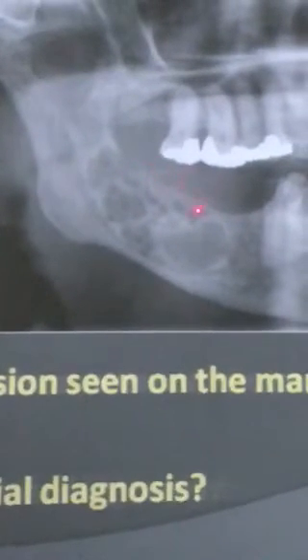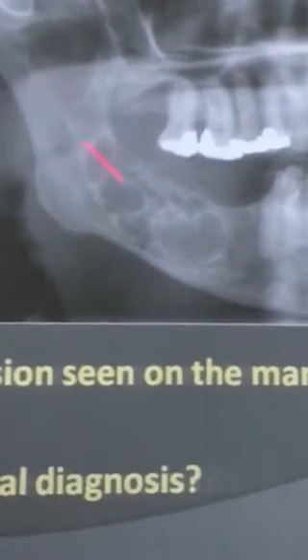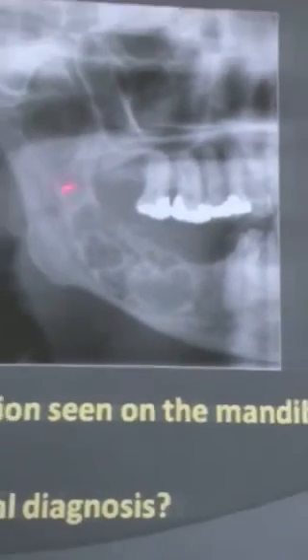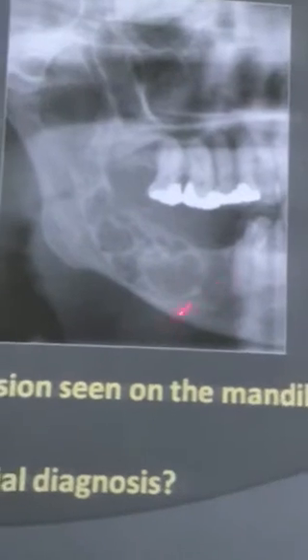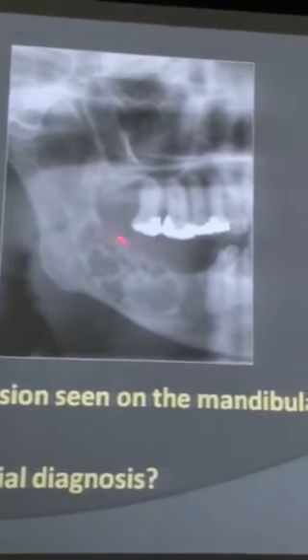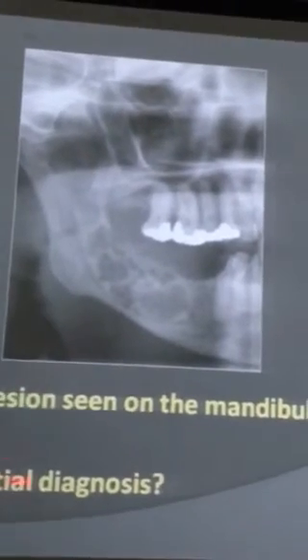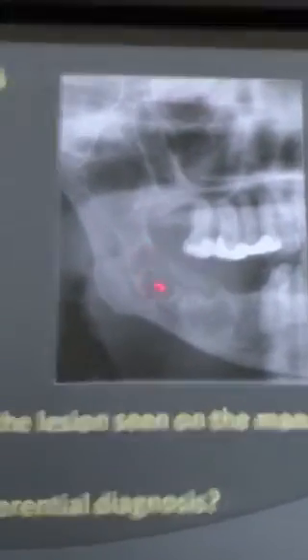There is a mild expansion of the alveolar bone here, right? Extension. So starting from mid ramus till the first molar region. Superior inferiorly starting from alveolar crest till the lower border. See, the second question is give two differential diagnoses. Ameloblastoma, then odontogenic keratocyst. Fine. Okay.